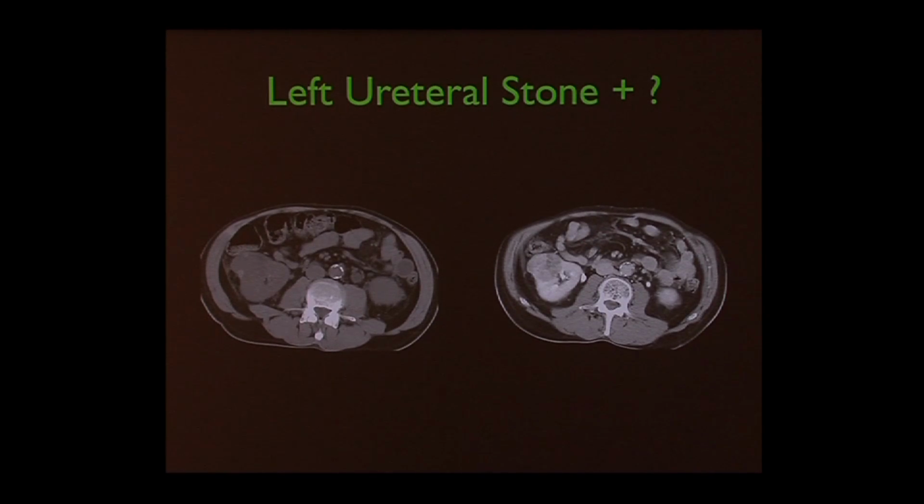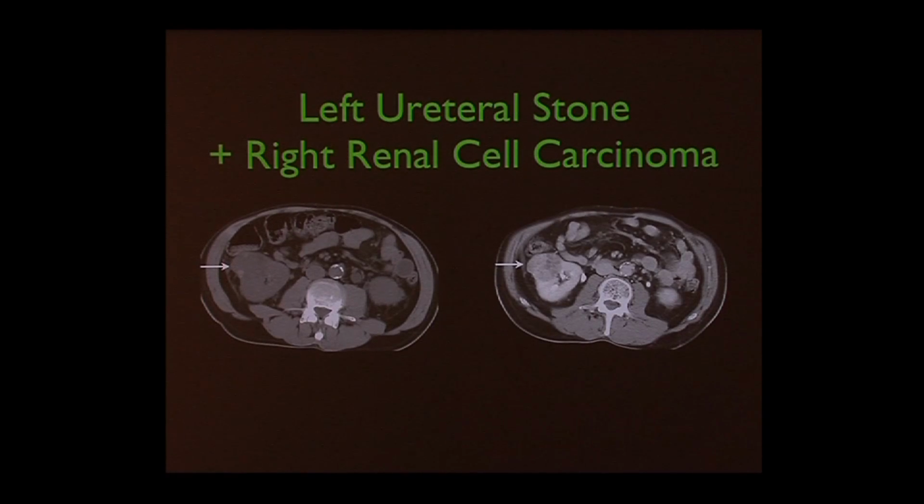There's a mass there that turned out to be a carcinoma. That was totally unexpected. So that was a more important finding than the stone we found. But that's not why the patient came in. The patient came in with the left-sided pain from the stone.